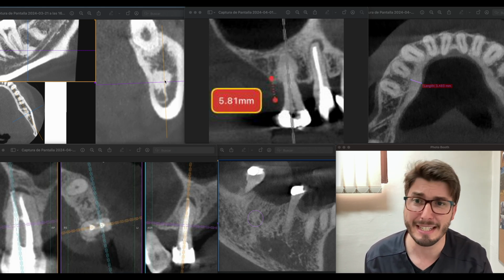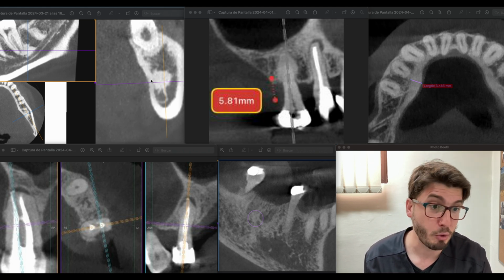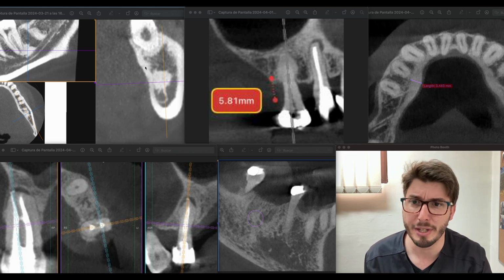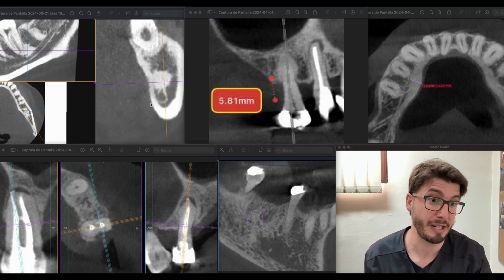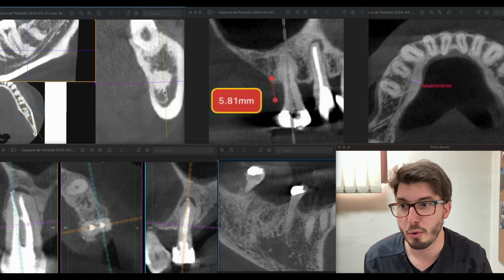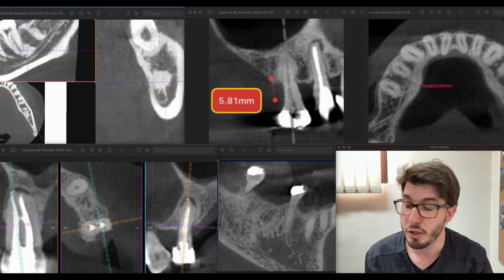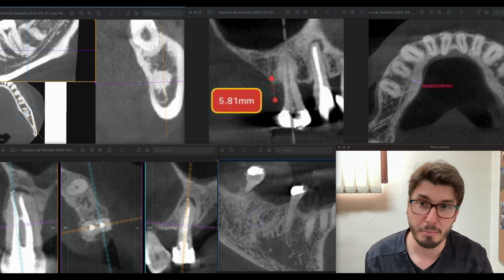The thing is that this region is in continuation with the cortical plate, the lingual cortical plate, very close to the submandibular fossa, okay? So we are talking about the posterior mandible, and then we have here the lesion also in continuation with the cortical of the mandibular canal, okay? So you guys are seeing that we have the mandibular canal right here, below the lesion. And then there is no expansion of lingual plate or buccal plate, no aggressiveness, but you do have the lesion.